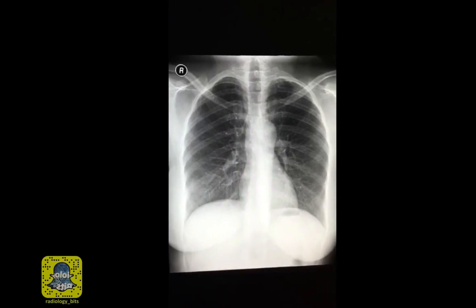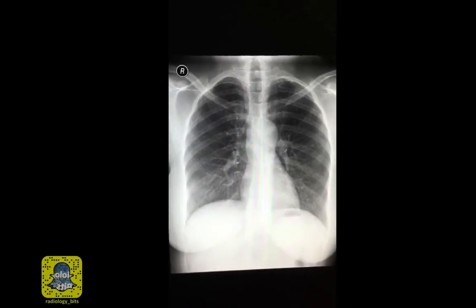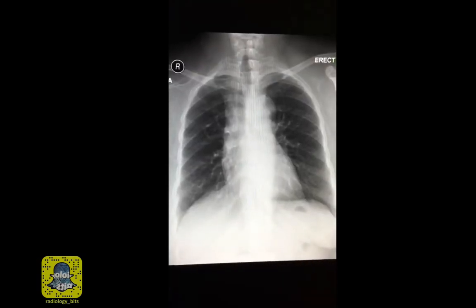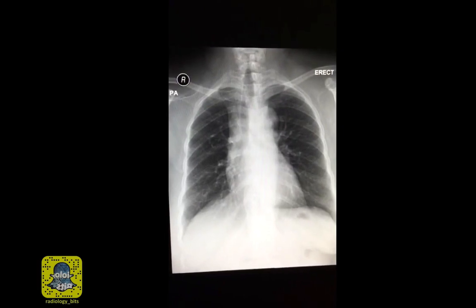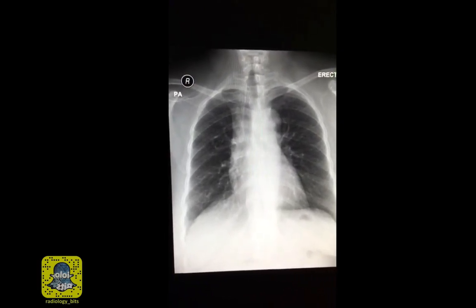So this was a case of lytic bone metastasis from breast cancer. To complete the story, this is the chest x-ray on the patient performed about 3 years ago, showing you a normal x-ray without lytic lesions. Now, the teaching point that I'm trying to convey today is extremely simple, yet extremely important. This is a point that I try to remind seniors, juniors, as well as myself of when reading chest radiographs.